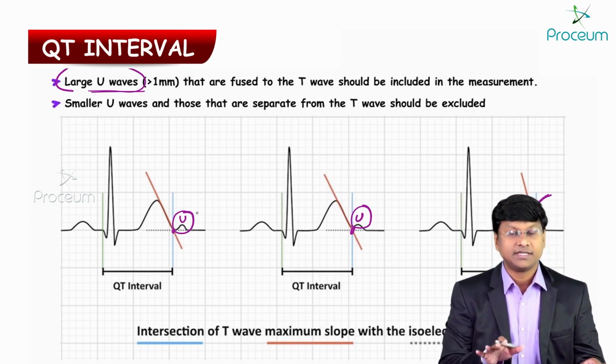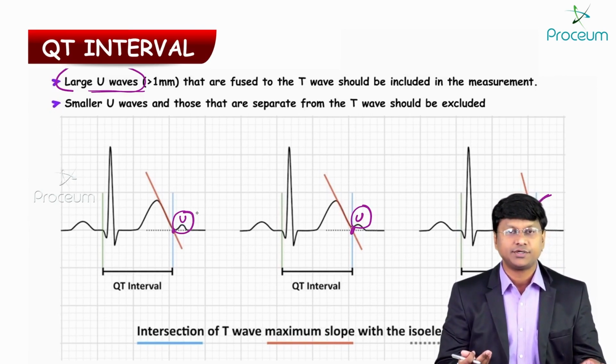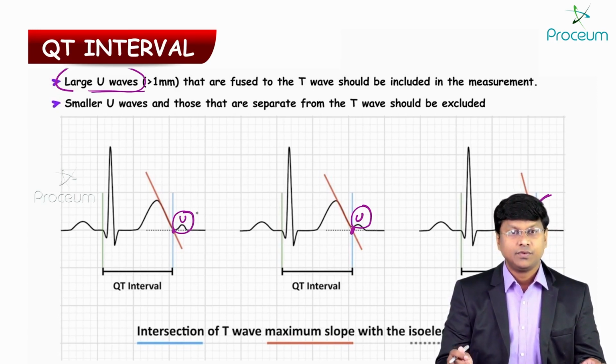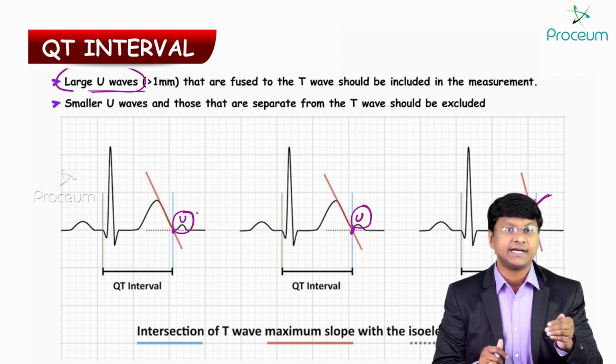So this is the basic introduction of the QT interval: how you have to measure the QT interval, from where to where is your QT interval, and what the QT interval actually represents. Now, how to measure the QT interval when there is tachycardia or bradycardia in the patient.